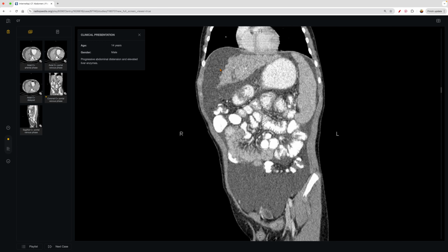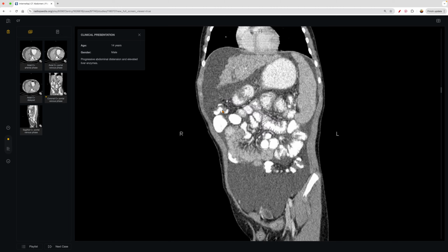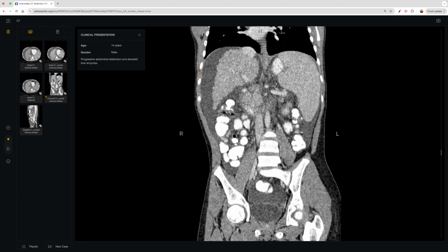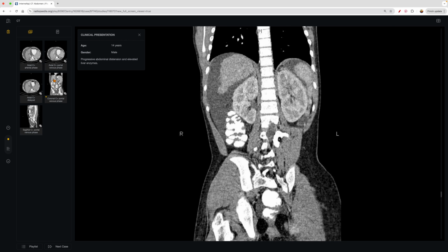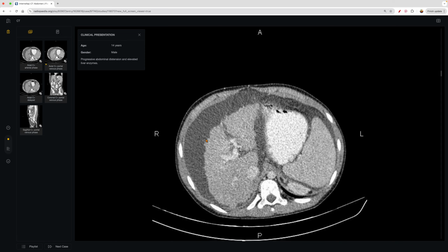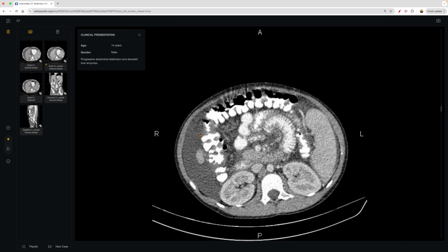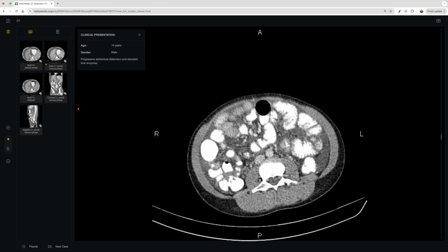And right, you can tell the difference between this fluid accumulation versus the blood in the previous patient, right? This is all ascitic fluid. This is all ascites here, all within the abdominal cavity. Now, let's look at it from this perspective of an axial view. Again, you can see all of that fluid, and then you can see the oral contrast that the patient had.